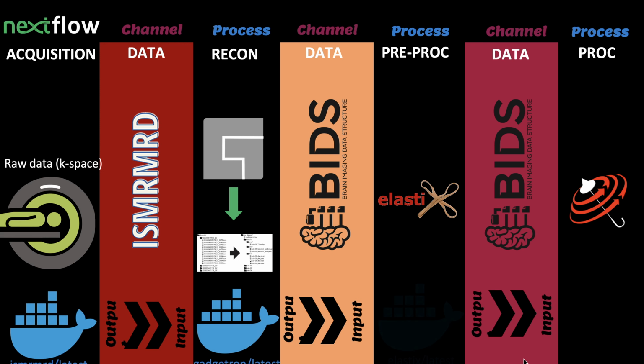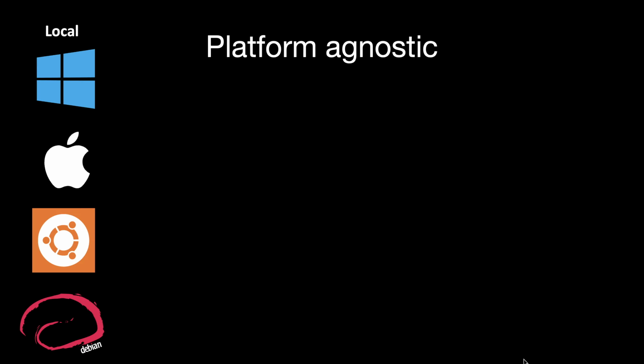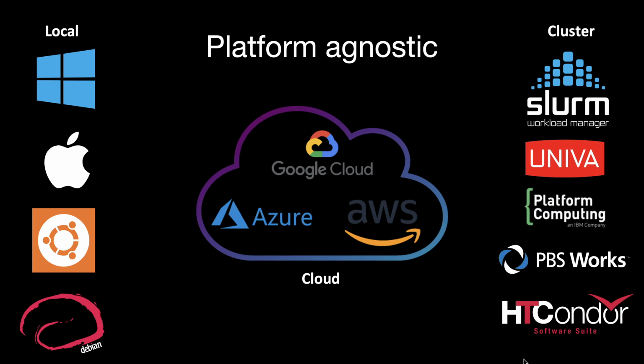This allows you, with the click of a button, to go from acquisition, converting this into ISMRMRD, then reconning it using Gadgetron, then converting into a BIDS format, doing some pre-processing, and then finally doing the processing in qMRLab, all within different containers, and all with Nextflow. Nextflow is platform agnostic, so you can do this locally, in the cloud, or on a cluster.